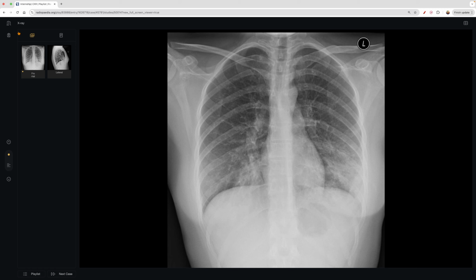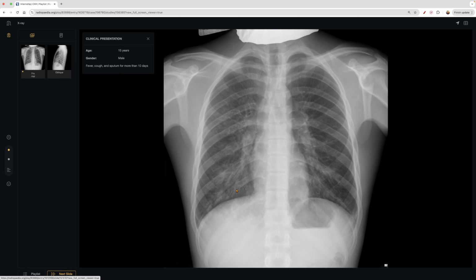And in this case, let's see what the indication was. Two weeks of dry cough. I mean, that's almost like a layup. Atypical pneumonia, right? Especially in a non-smoker. You have that long, prolonged history of cough, walking pneumonia as they call it. So you can see that bilaterally. And then we go across here, and then, same idea.